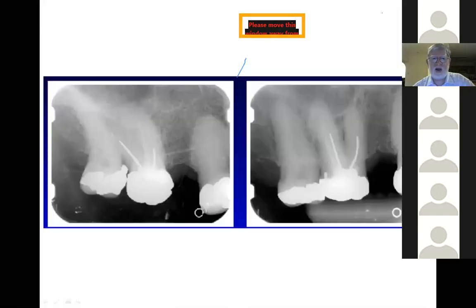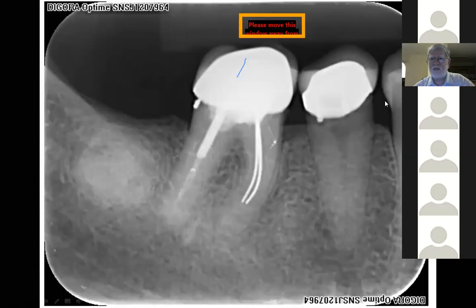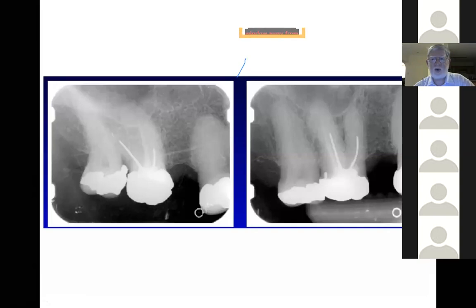Okay, so here we are. Poor endo and any periapical pathology? We are here, yeah.